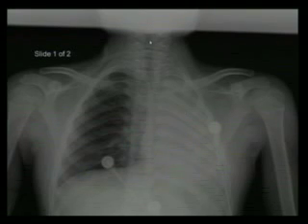You always look for a radiopaque foreign body. But here you don't see a radiopaque foreign body, but the main stem bronchus kind of stops, and then you have total opacification of the left hemithorax with total shift of the cardiomediastinal silhouette to the left and hyperinflation of the right lung. This tells you there's left lung atelectasis. You have to worry there's an endobronchial mucus plug.